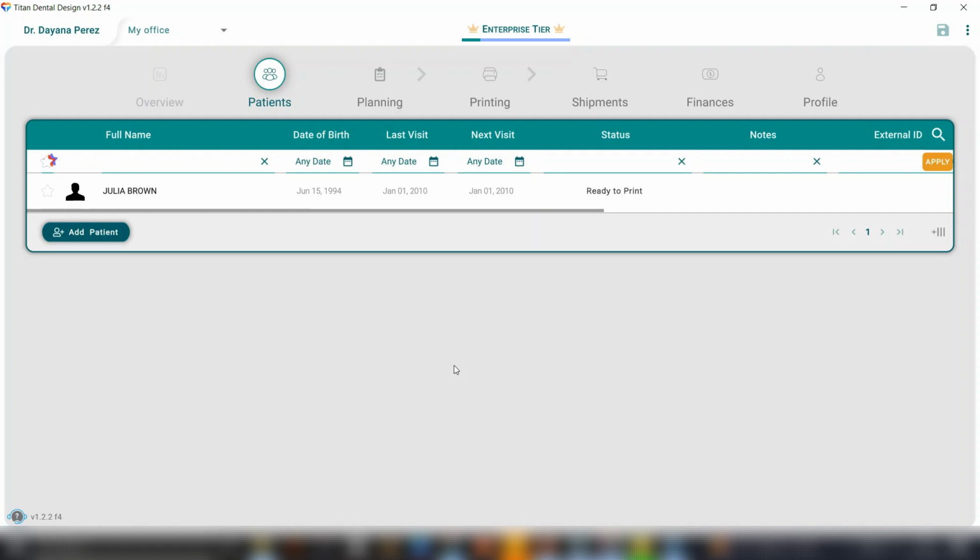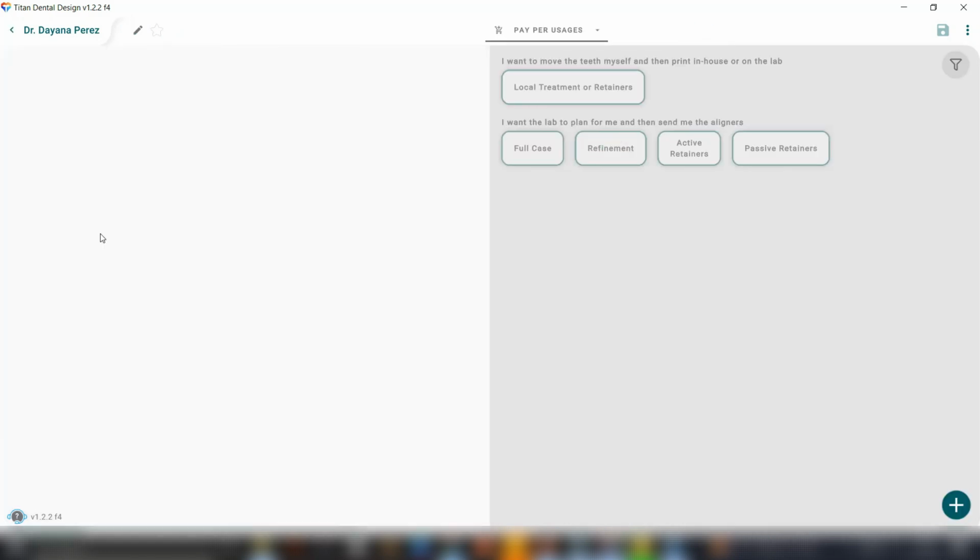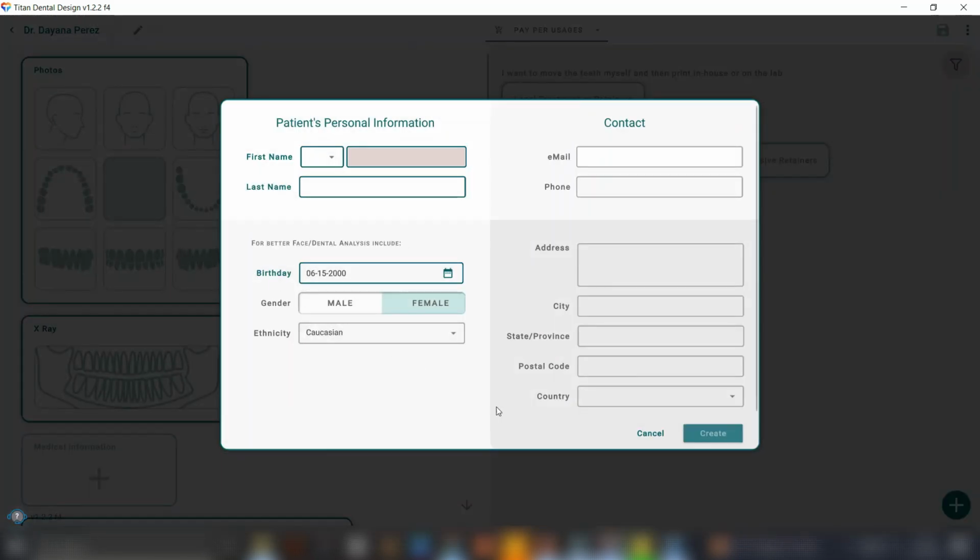In this video, we will teach you step by step how to send a case of passive or active retainers to Titan Lab for printing. Let's get started. First, start by creating a new patient in the Titan Dental Design software.